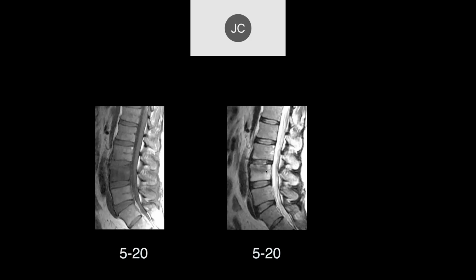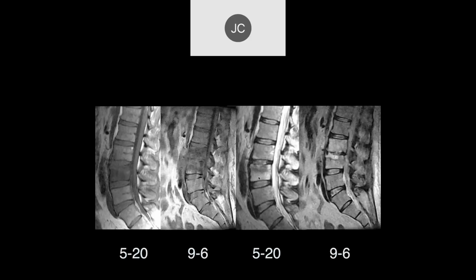We used to use that a lot, especially before we had fat suppressed images where you could see the edema a lot better. So this is in May, and on the T2 weighted image, we maybe see a little bit of increased signal intensity compatible with some edema. That's 5/20. The patient came back now a few months later, and what do you see?